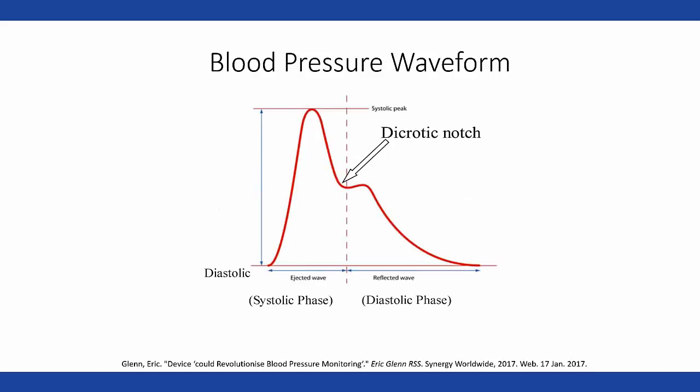And again, we're going to zoom in a little bit more to look at the components of this waveform that we're looking at. So this is what we thought we would see in the previous slide, showing the systole phase and then the diastolic phase there on the right. And then the most important thing is that dicrotic notch that we're looking for. And so that's just kind of brief. Now we're going to actually jump into the BPV analysis application, and we'll go from there.